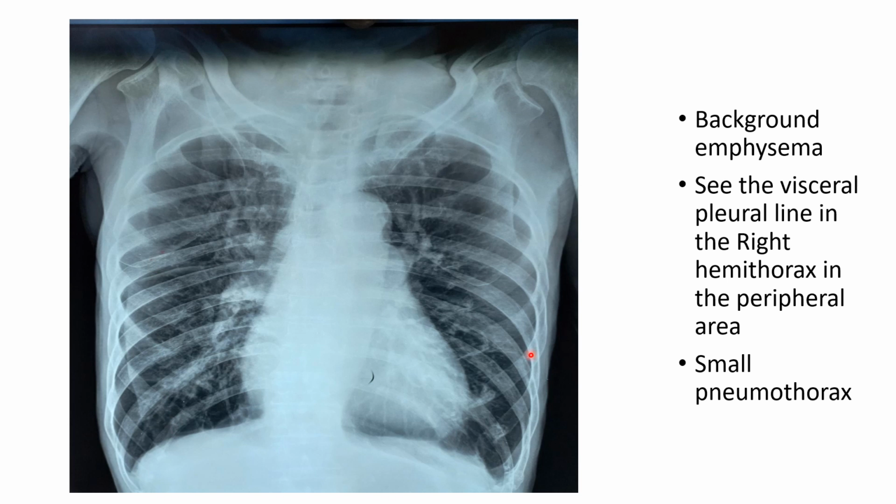Mild pneumothorax. So in appropriate patients, if things are doubtful and patients are stable, reasonably saturating okay, then you can provide oxygen and send for a CT scan if it is in-house in the same hospital and confirm it when you have doubt. Because if patients are stable, then you can do further investigations. Otherwise, you can do a bedside lung ultrasound.